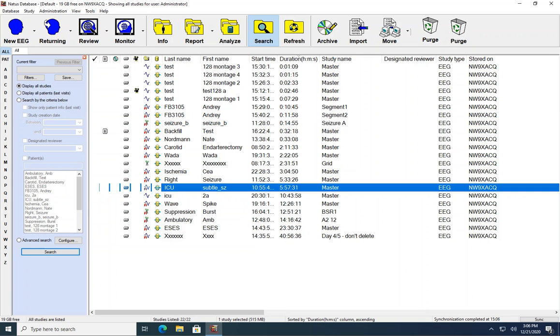Hi, this is a very quick ad hoc screencast to go through setting up the EKG channel trend in Persyst. I'm going to show doing this within the integration with Natus NeuroWorks. And so let's go ahead and get started.